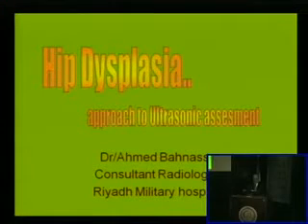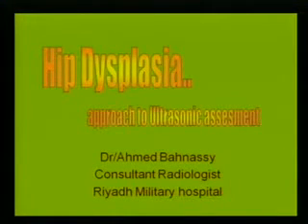The topic today about hip dysplasia is about building a rational approach to ultrasound assessment. The story of ultrasound and hip dysplasia is a long story with different schools in the world. Some European schools are advocating the use of angles. The American school are advocating more the dynamic study.